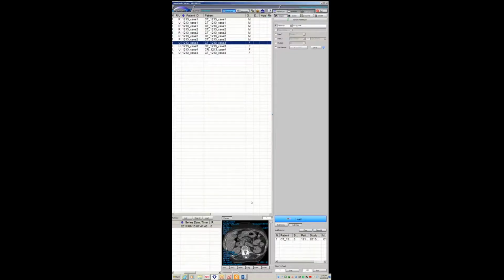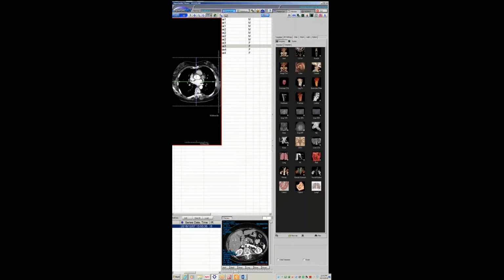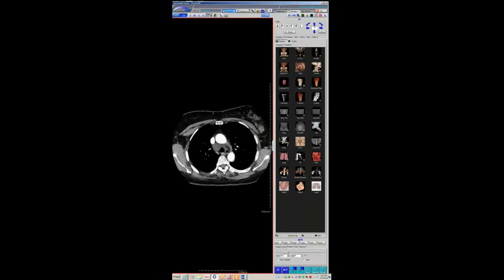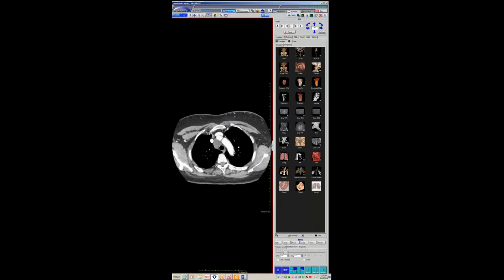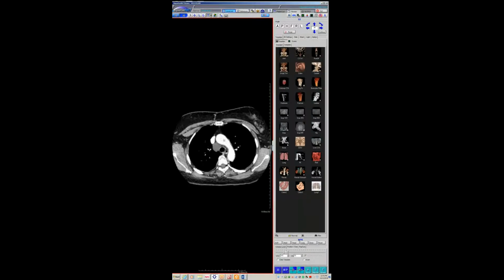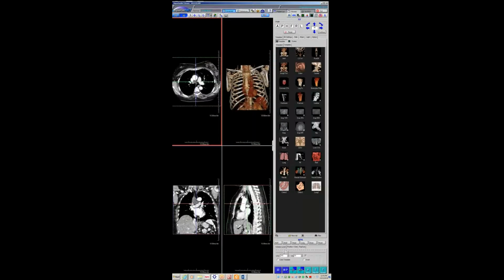So I'm not 100% sure. This is a cool case because this is the biggest one of these I've seen personally, and this was called a cyst, which I kind of understand, but it has a very, very characteristic appearance where this is all fluid attenuation. It sits in this right paratracheal location, and then as the aorta comes across, it kind of dives posteriorly.